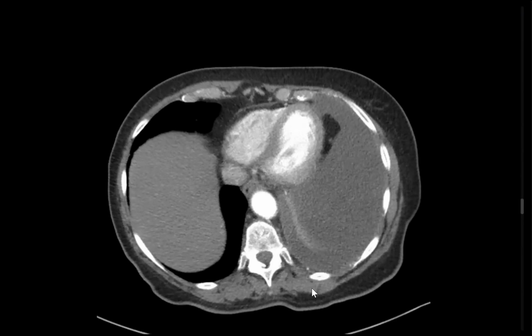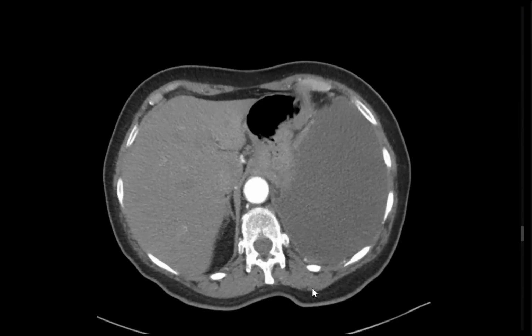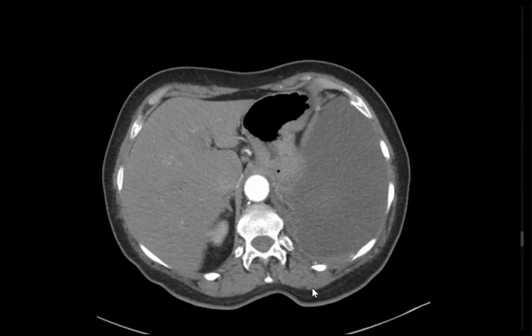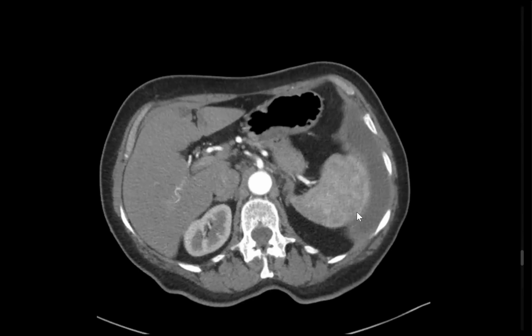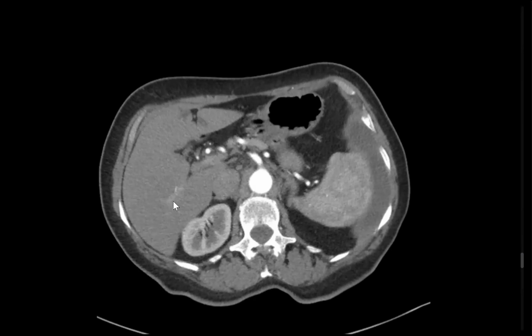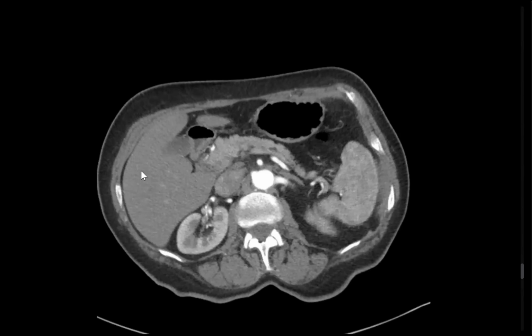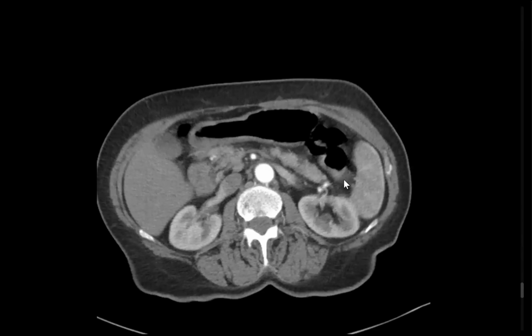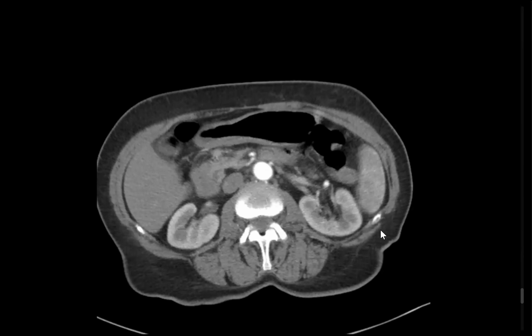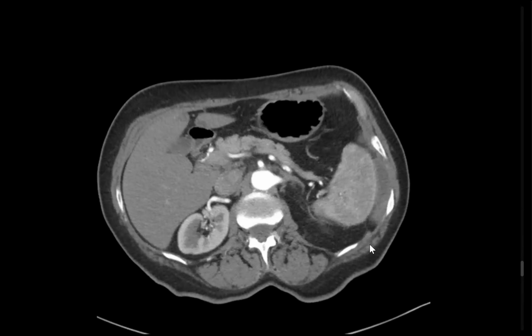It's very important to see the bones while in mediastinal window. Some tricks will be there. Anyway, I will look in the bone window to see the bones, and also the lung window, I will check for the lung nodules. And in the liver, I'm looking for any metastatic nodules which I'm not able to see. Visualized pancreas, spleen appear normal. I will look at the adrenals also specifically for any metastatic deposit.